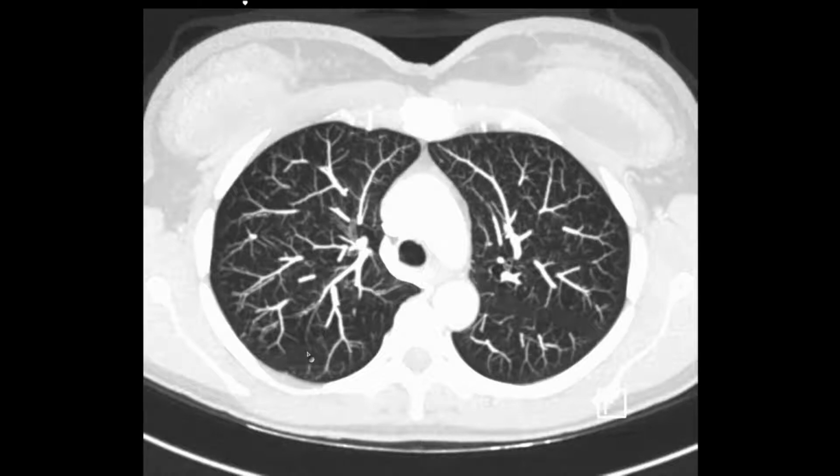Yeah. I always thought that these would be on one image, and then the next time you follow up the patient, you would think that if it's mucus, it should be coughed up. But sometimes they're there again, in exactly the same place 3 months later, and I have no idea why. Several years later, in some of our cases, we're doing these longitudinal studies, and they bronch the patients and find a lot of eosinophils in some of these. It's kind of interesting. Yeah.